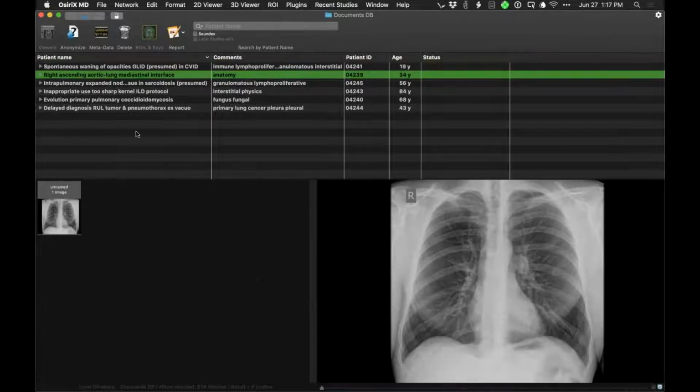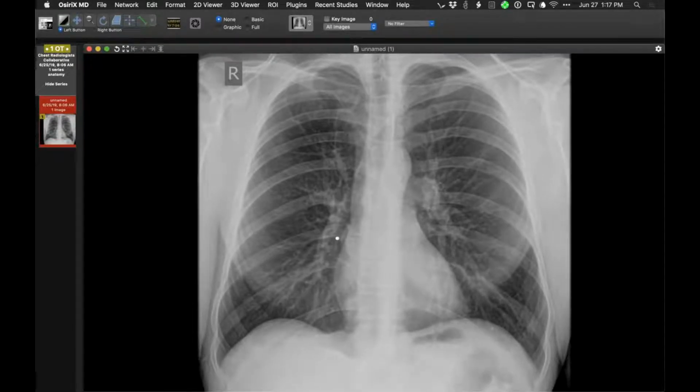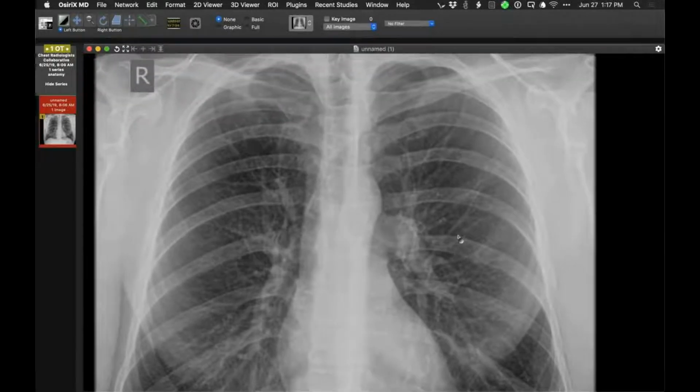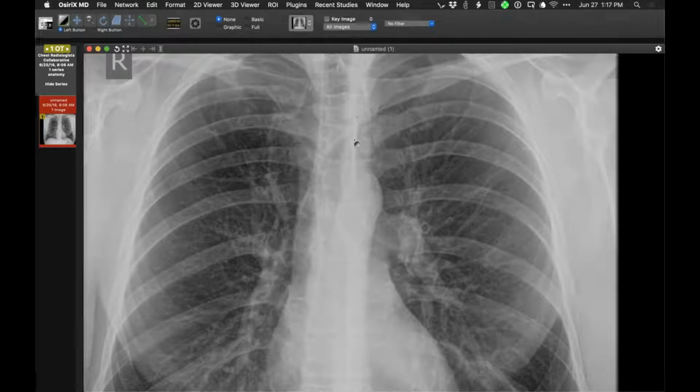And this is just plain old anatomy. Someone the other day was asking me what a certain interface was, so we were teaching just basically anatomy. So this is a situation that is not common, but it's not rare. And it's a situation where, and I'll go right to the area of interest, where one can teach about the anterior or the posterior junction line being up here. But this is the interface that's interesting.